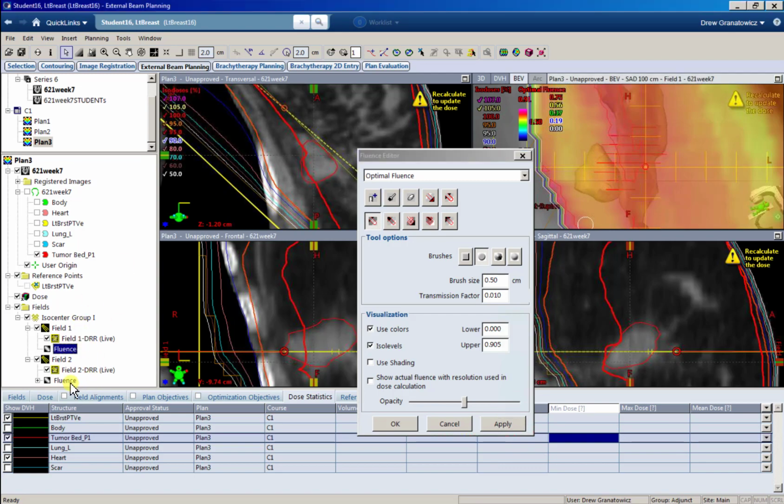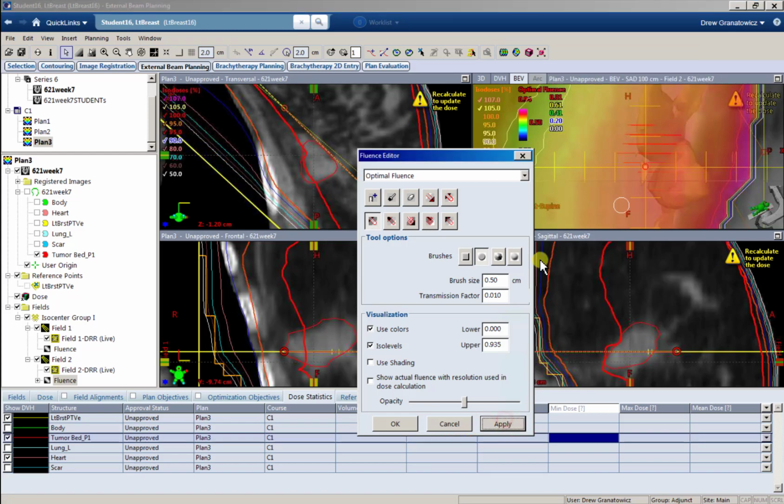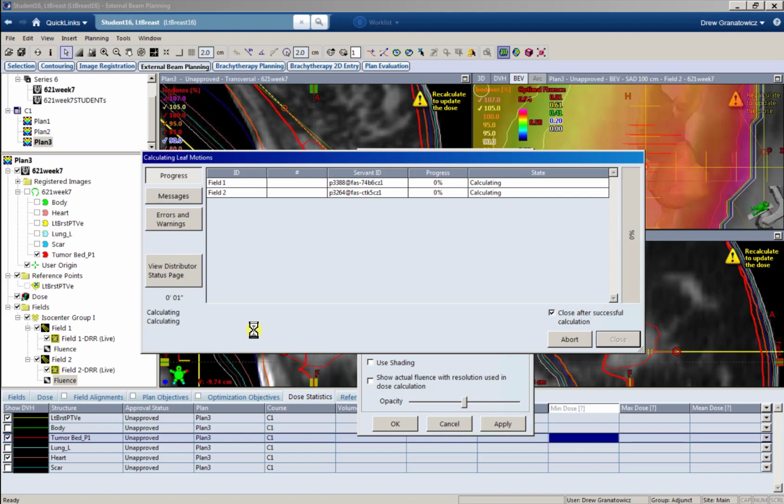And since we're still pretty cold, I'm going to actually do both sides at the same time this time. Like that. So I just added that 0.01 to both sides. Again, just to speed this up a little bit.